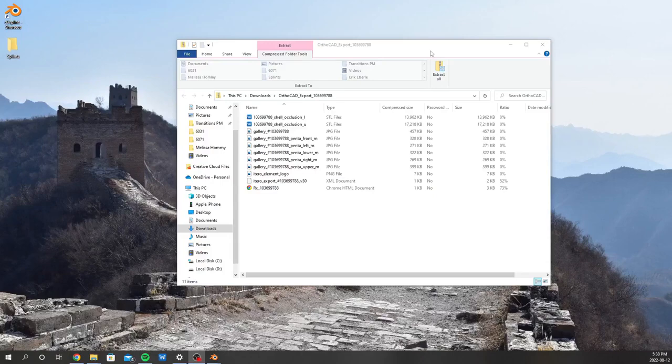This video is going to show you how to make splints. The software we use is called D3 Splint. We'll open that in a second. We need a couple scans in order to use this.